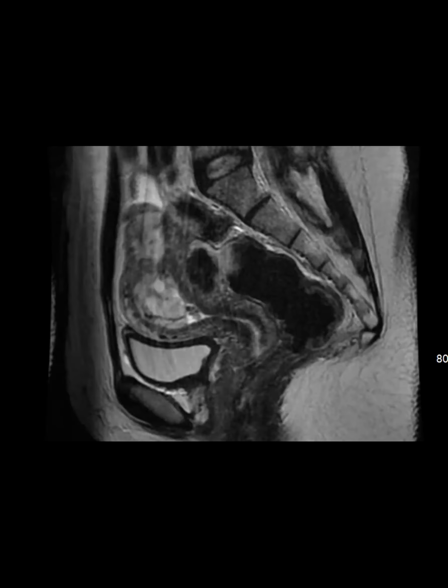And then when the sample from the curettage was sent to pathology, they didn't find any villi within the sample. And so they had a repeat ultrasound, which was unclear as to what is going on. And so they were sent to us for an MRI. I don't have ultrasound images, but I do have MR to share with you.